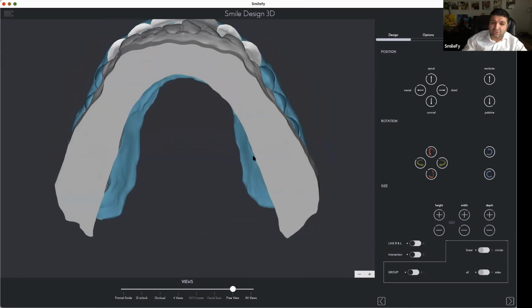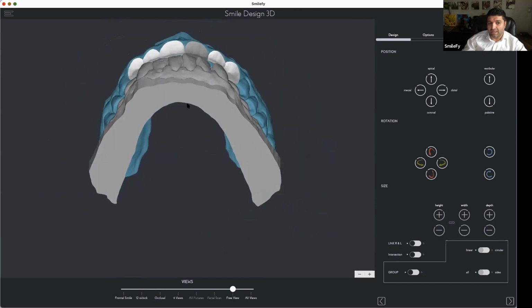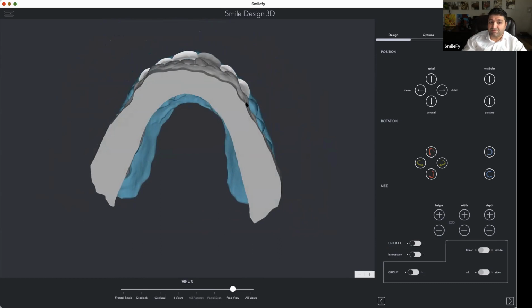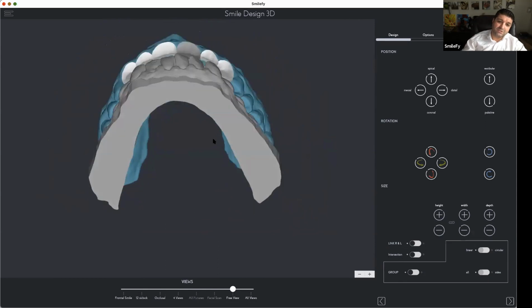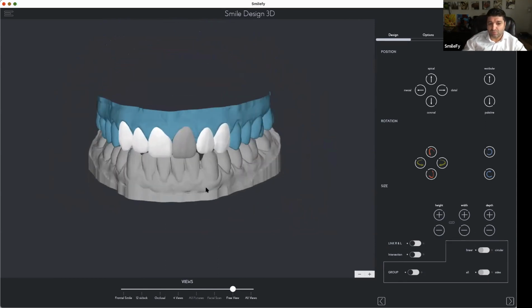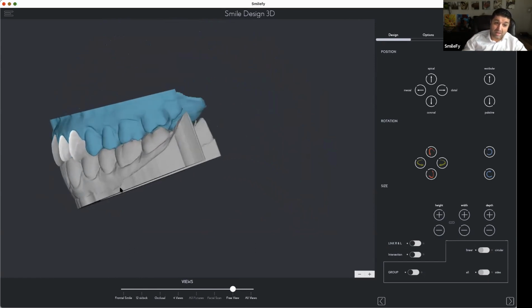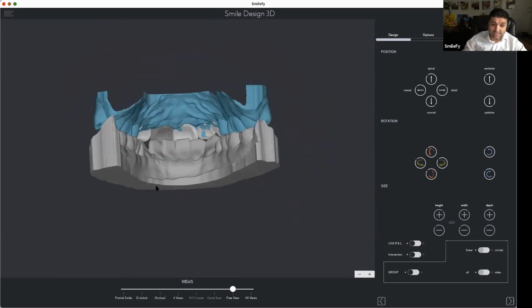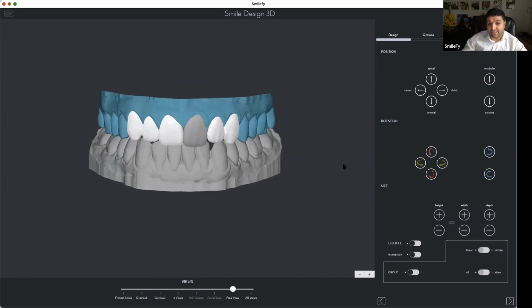But to create a digital prep and calculate where the ideal position of your design should be, and then see if the planning works with the lowers, that's super interesting, and it gives us so much more insight into the situation of the patient, and how we could design and treat and do all our plannings. So that's something that we're gonna focus on, more clinical, more precise.